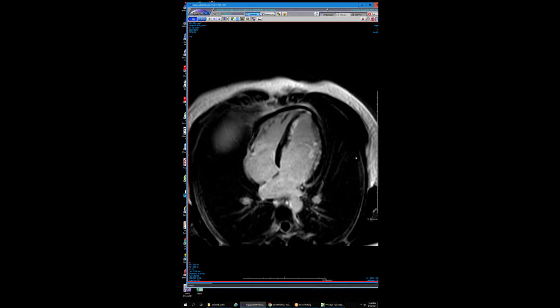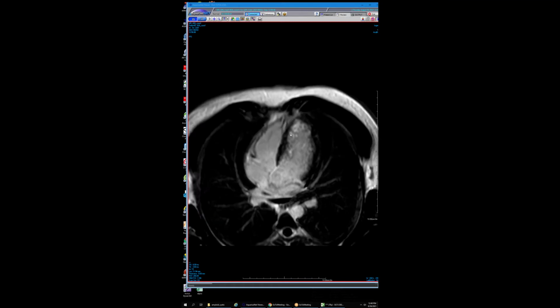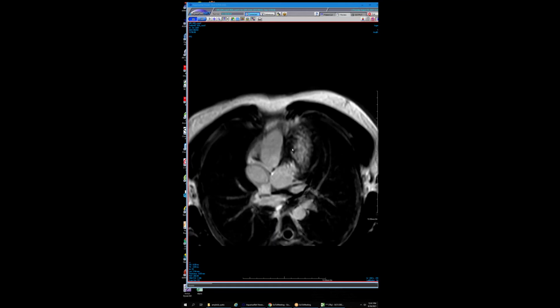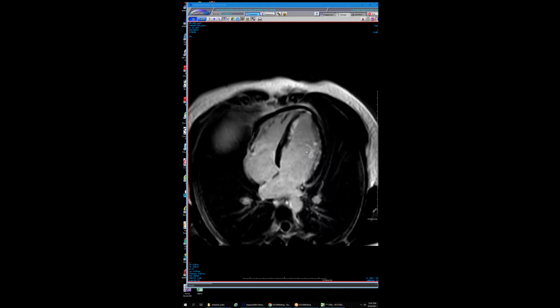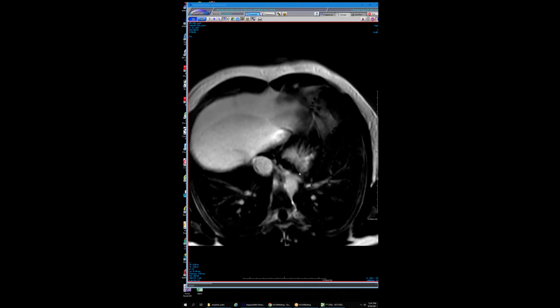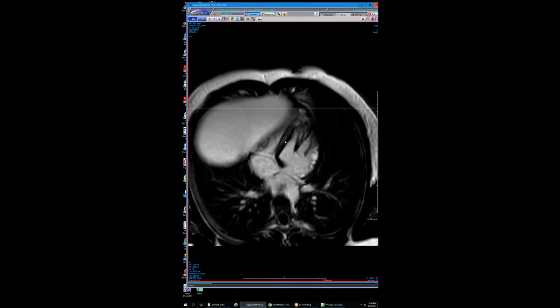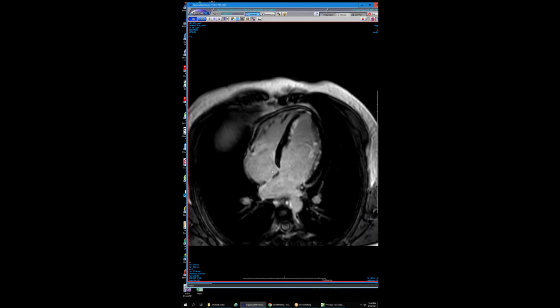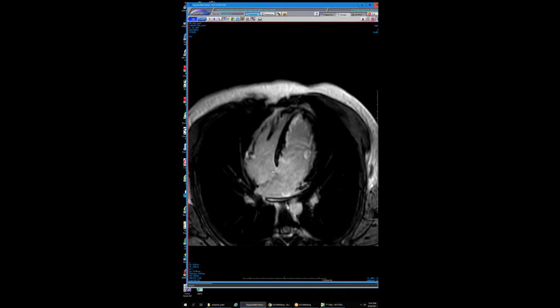Here we go. So you can see, obviously I like to look at my delays on the short axis. These look more like single shots. They were done at the outside, but you can see the extensive septal enhancement as we get more to the anterior wall. This is going to be all that LAD territory. There's some circumflex injury. Presumably this is circumflex down here, and the RCA, which is all this other stuff, is spared. So pretty profound left main injury.